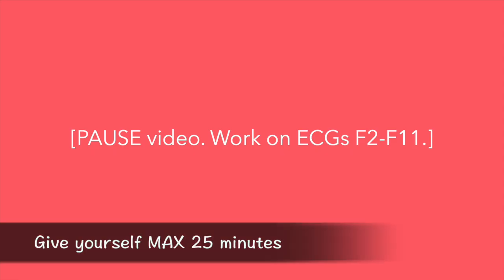Alright, it's time for you to practice. So pause the video right now and work on ECGs F2 to F11. And once you're ready, please resume the video and I'll review the answers with you. So please pause the video and work on ECGs F2 to F11.